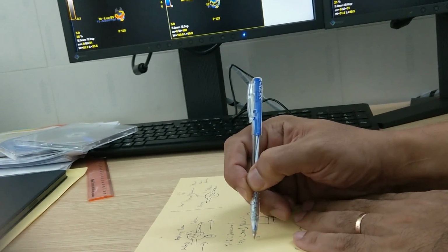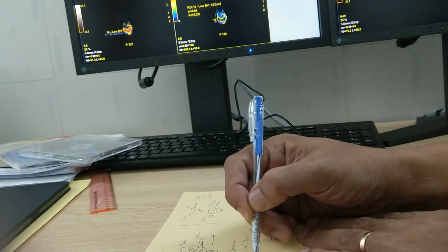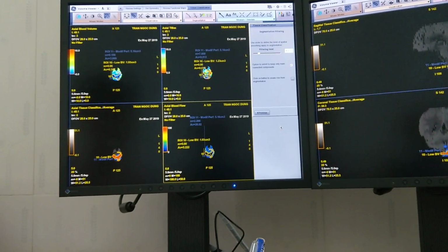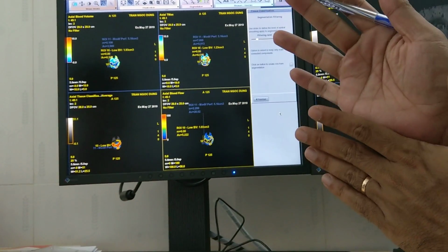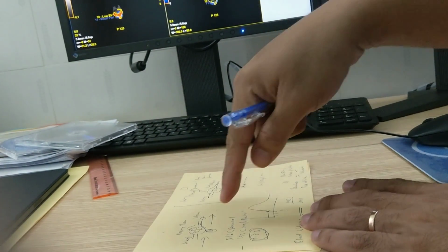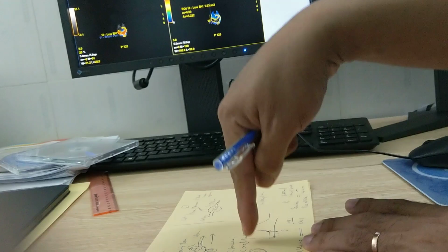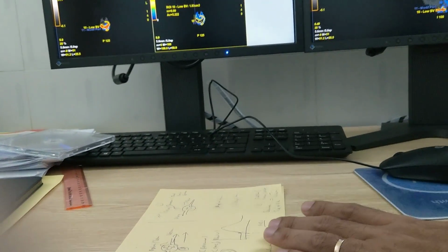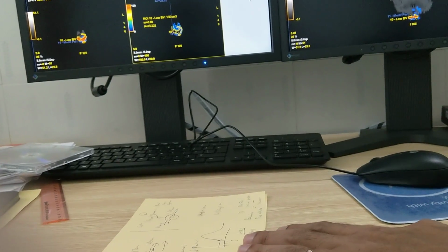So you will get how much? This is the area of mismatch. Okay. If you want, because all the blue one, you know that the penumbra is bigger than the infarct. So much tissue can be saved if they do it.